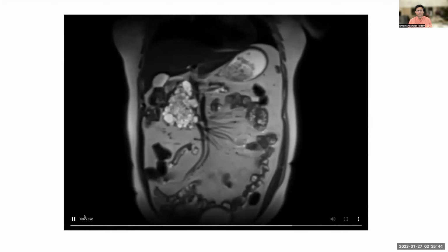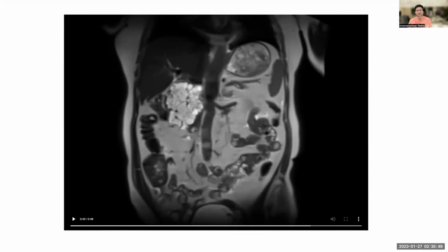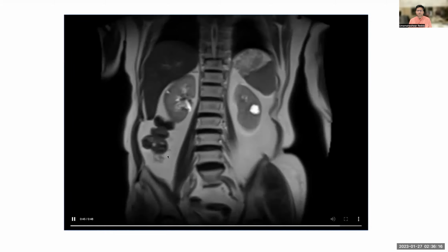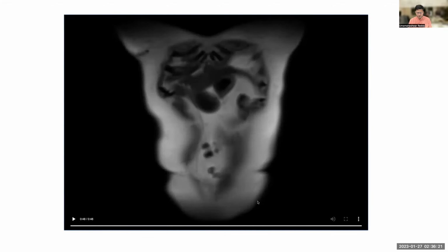This is coronal MR sections. You can appreciate subtle ductal dilatation, central calcification, and radiating polycystic or microcystic variation, a stellate shaped lesion in the head region of pancreas. So this is a classical serous cystadenoma. Now, the most common and close differential diagnosis is mucinous neoplasm, which predominantly won't show so many septa within. Mucinous neoplasm shows few septa, and again duct dilatation will be marked in case of mucinous neoplasm.